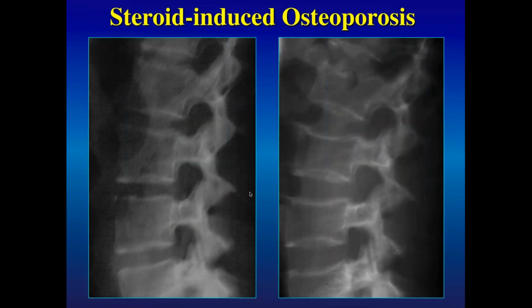This is an example of perhaps the most aggressive steroid-induced osteoporosis that I have imaging of, representing a 13-year-old girl with lupus who is treated with very high-dose corticosteroids. This is more or less at baseline, and this is within about 4 to 5 months. We can see that there is extensive compression of the end plates, and we're beginning to see as well that empty box configuration.